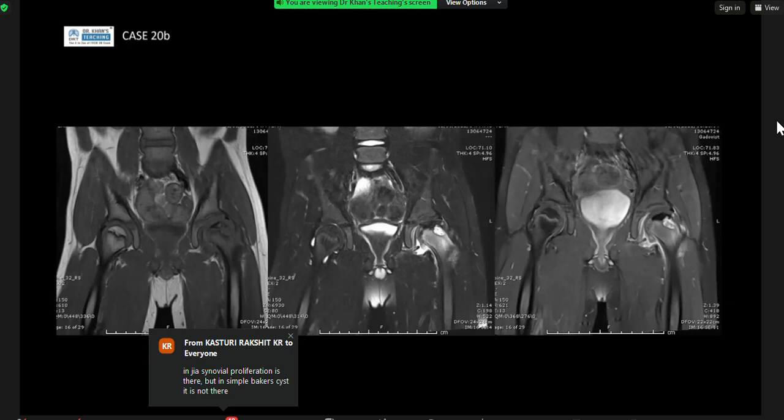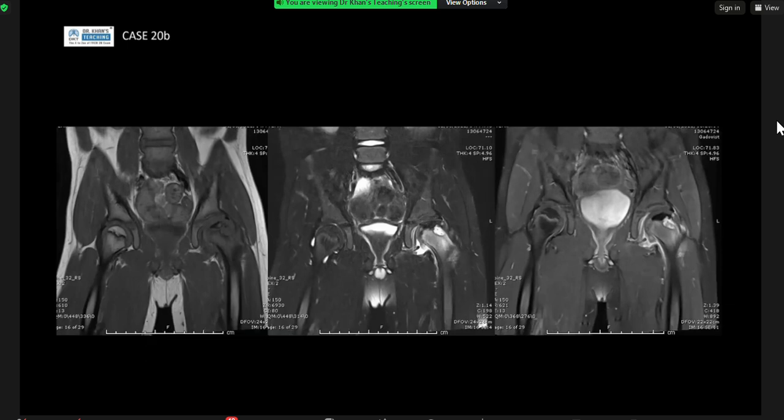On the MR, I see that in the left femoral head there is a T2 hyperintense area with surrounding edema. There is also a hypointense line on T1. Are you changing your diagnosis? Are you adding more to your diagnosis, or are you keeping with the same diagnosis? No, I want to change the diagnosis, because this doesn't look to be avascular necrosis. This looks to be a T2 hyperintense area in the intertrochanteric region, in the neck of the femur, with surrounding edema.